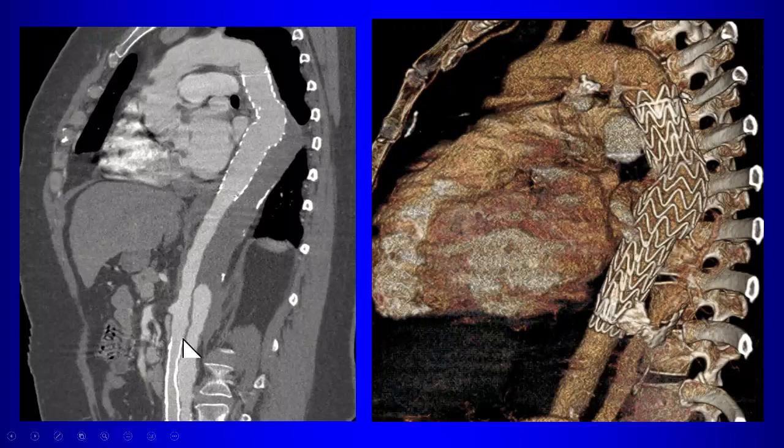So it's not unusual, if there are fenestrations lower down, to have retrograde flow coming up the false lumen here, where the proximal part of the false lumen will thrombose off, but you'll get retrograde flow that will maintain patency of the distal part of the false lumen because of fenestrations, because of openings of the dissection flap more distally.